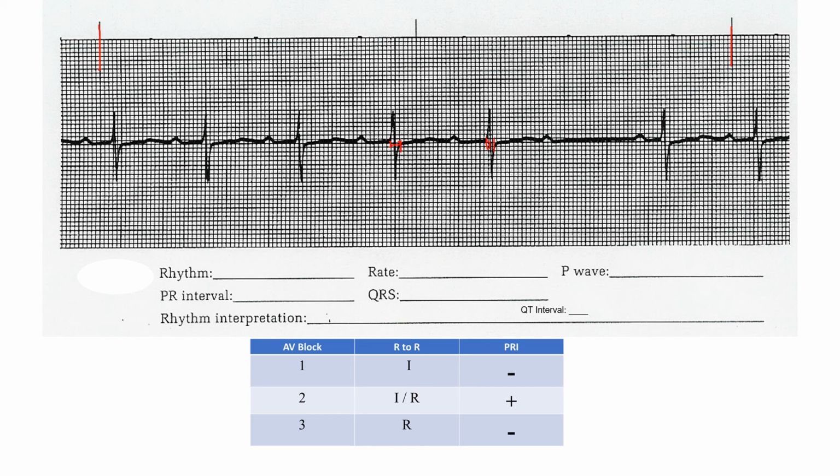And your QT interval, it's real hard to see whether it's coming up. It looks like about 10 boxes. Is it going all the way to the T? So it's real hard to do your QT interval. But let's look at what I would say, it's probably 5. Oh, maybe not quite 10. So maybe about 7, 8 boxes. So it looks like about 7, 8 boxes.